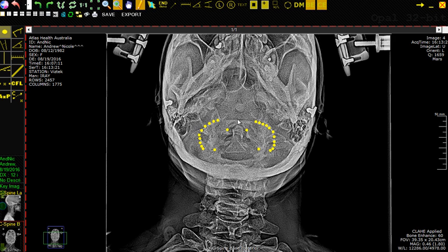Now, the point of all of this, as you can see, is this makes these arcs on the left side and on the right side. But there are still these itty-bitty little gaps in between. And so if we were doing this on paper, or on an old x-ray, we would actually draw a straight line connecting all of these dots.